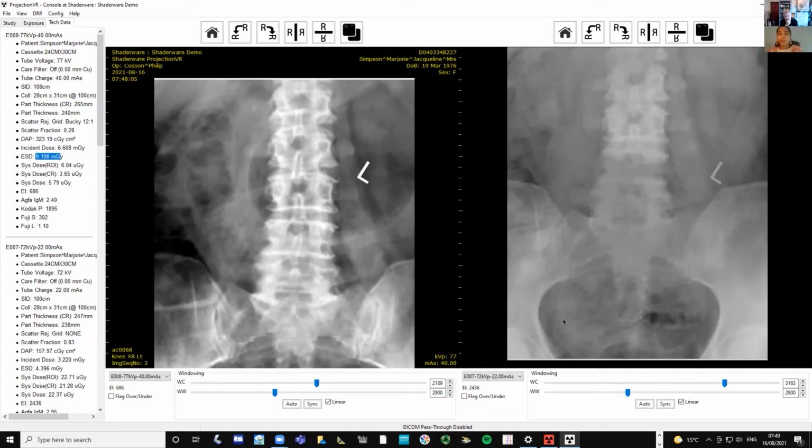It's very useful because, like you said, teaching the difference between grid and non-grid procedures is somehow difficult, especially now that there is a pandemic. It's really difficult to discuss this with the students. But with this one, it's very, very easy, and they can manipulate it and really work on it, learning by experience, learning by doing, because there's no radiation protection needed here, as it's all virtual.